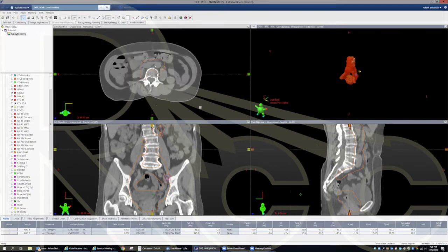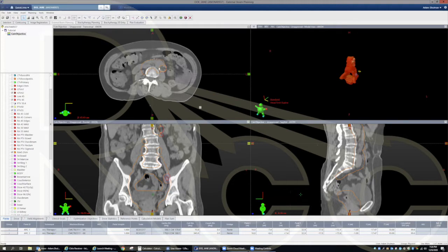And then the next thing that I want to do is, we want to have distinct dose levels, 4 distinct dose levels. In this case, actually 5 distinct dose levels. In order to do that, I don't want too many hotspots in each PTV. So in this case, it's primarily 1 larger PTV, so I'm more worried about the hotspots here. And so in order to do that, I will subtract out a margin, so it'll be the same DVH structure, but I'll subtract out a little bit of margin around the higher dose levels.